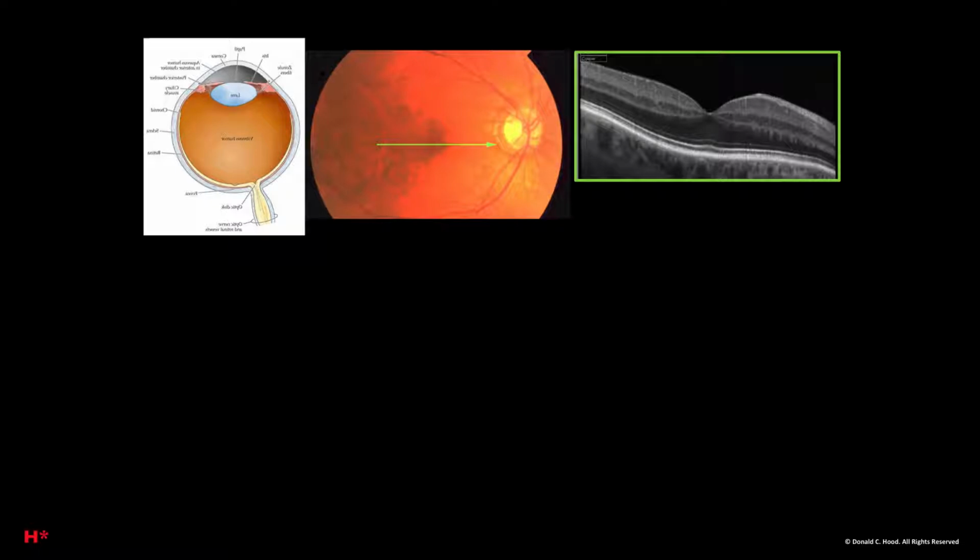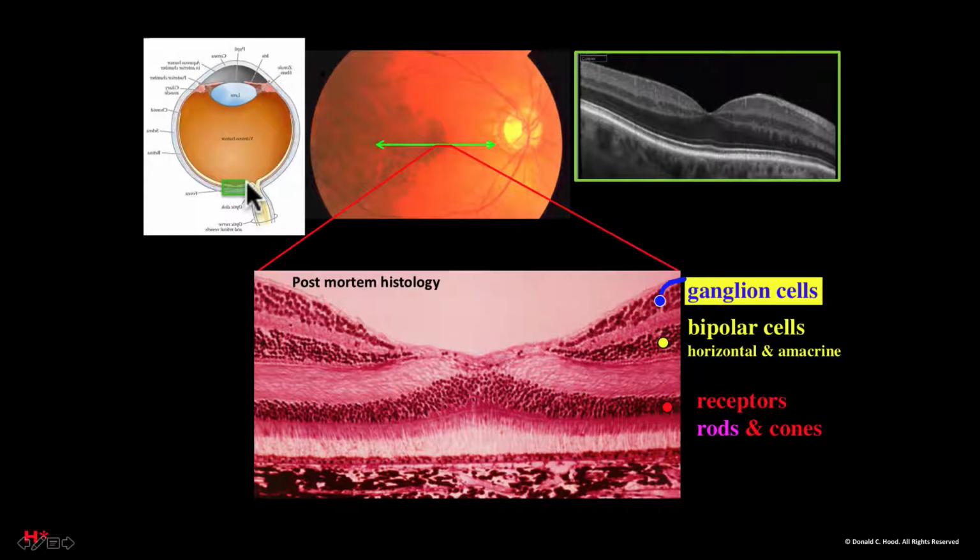All right, here's a line scan on the right here through my fovea. It's about that much of the back of my eye, and on this schematic here would represent about that much of the eye. I usually point out this is not me. This is post-mortem histology of human tissue. If it were an eye and you scaled it up to fit in my eye, it would look something like that. So we can blow up this region and compare the histology to the OCT.